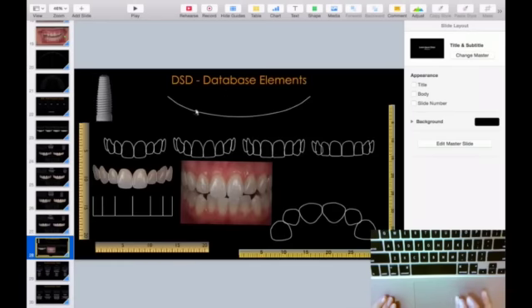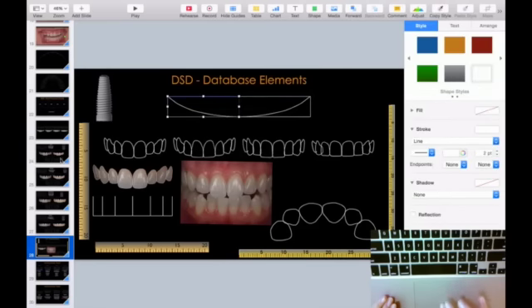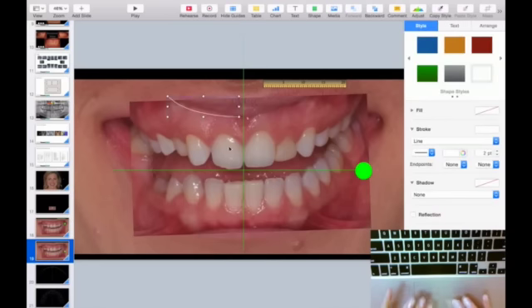So what we do is we double click here, we copy, and we place it in our template, and we see a curve here that we think might be suitable.